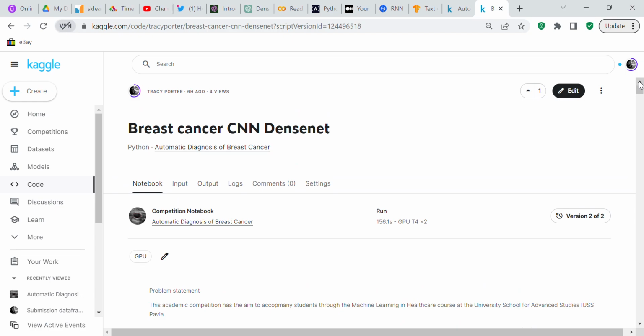So what I did was I went ahead and ran up the test set, and I tried my best to submit my predictions to Kaggle, but because they didn't give us a sample submission file that I could see, Kaggle would not accept my predictions. And I gave the organizers of this community competition a comment asking about the sample submission, and they haven't responded to the post. I put a post on the discussion board.